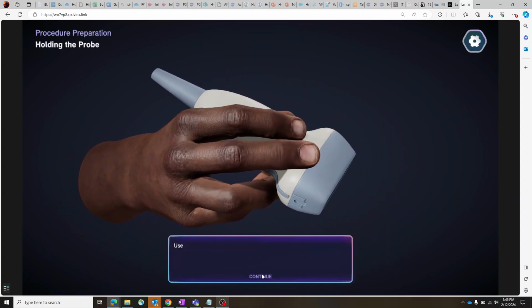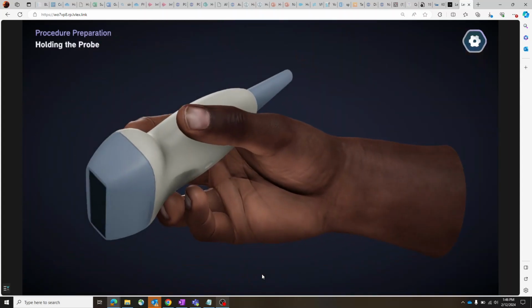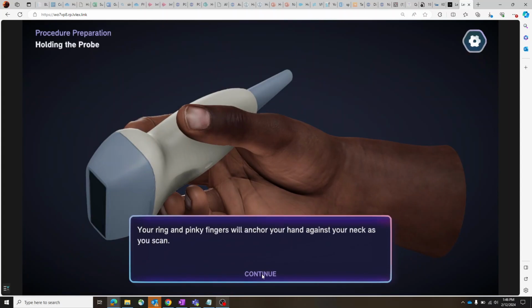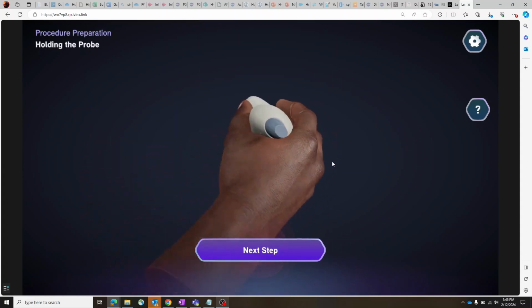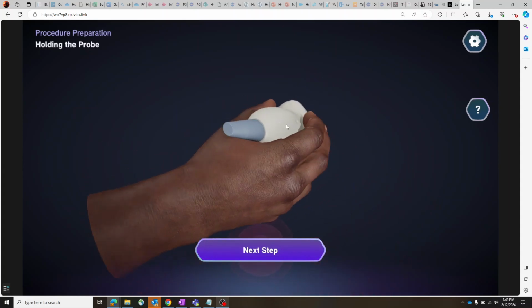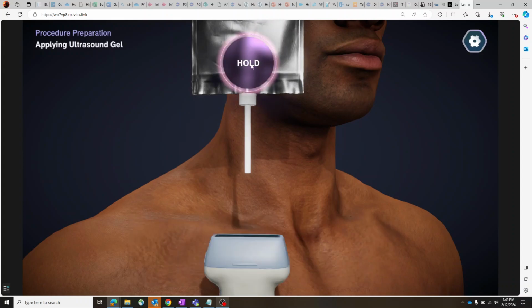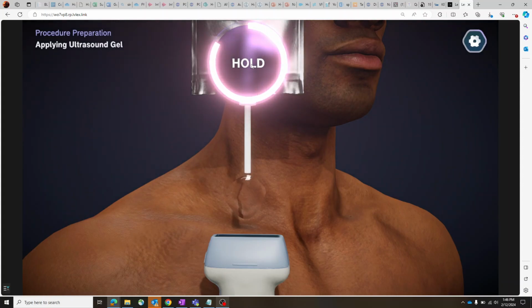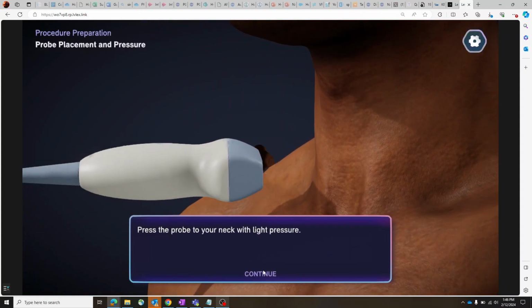For this interaction, it'll be able to tell if you've gone too fast, too slow, or if you've moved off course, and it'll give you feedback as you go through and practice. We're anticipating getting a lot of good metrics here based on how users are accomplishing this path and how that translates to their performance in the actual ultrasound assessment. And you can notice as we're going through these different steps, we're again increasing the difficulty. We've turned off the timer, we've turned off the guide, and we've also introduced the ultrasound image so you can watch how that's changing on the left as you're following the path.